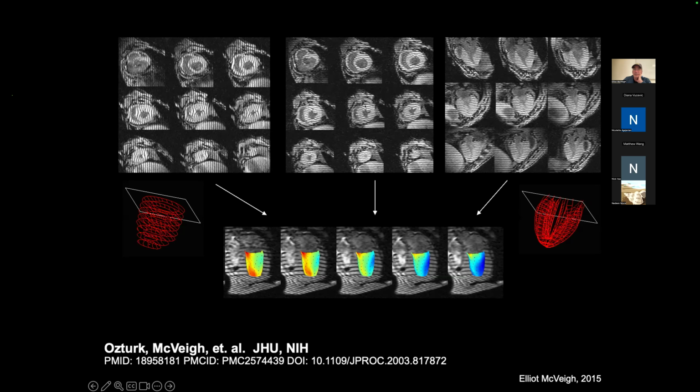We've taken the exact same image or slice for this image, and this encodes the up-down displacement of all of these voxels. They're different than these ones, right? But it gives you a field of displacement values for the up-down direction. You get a field of displacement values for the left-right direction. The points aren't the same point that you're measuring, right?